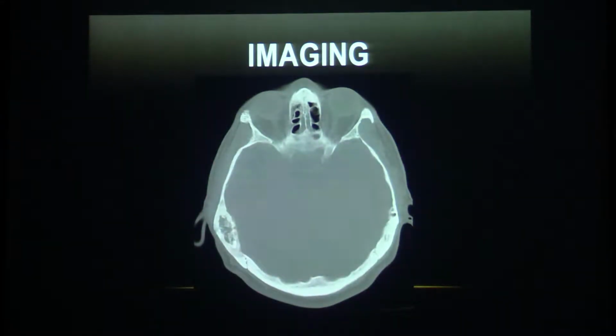And in the CT scan, we see this bony lesion. We can see an expansile bony lesion. We can see a thickened inner and outer plate. We can see the cortex is thickened yet intact. And within the lesion, where the corticomedullary differentiation is expected, we can see ground glass opacities. We can see that there is no soft tissue reaction, no effect on the adjacent brain tissue, and no aggressive periosteal reaction.